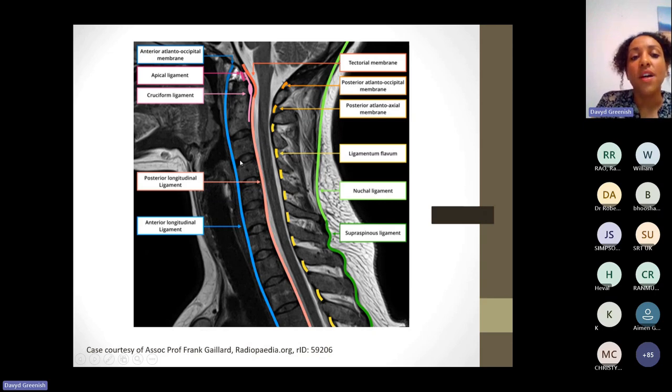I would certainly try to recognize the anterior longitudinal ligament, and it's easier seen, I think, in the sagittal plane, but don't forget to try looking at different MRIs when you're at work, to see if you can see it in the axial plane, and if you can see it in the coronal or in all other planes, but I think that'll be trickier. So sagittal is good for that.